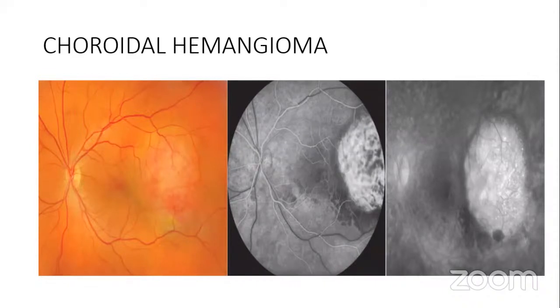Okay. Now, if we come to the late film, late because the vessels have emptied out, the choroidal hyperfluorescence has diluted with time as well as the vessels, but you still have a hyperfluorescence here. So some of the dye is within the tumor. Okay, so it's a pooling and also a leak within the tumor. All right.